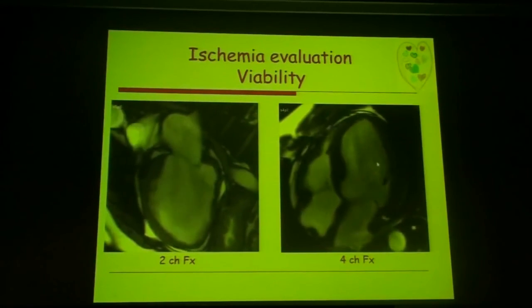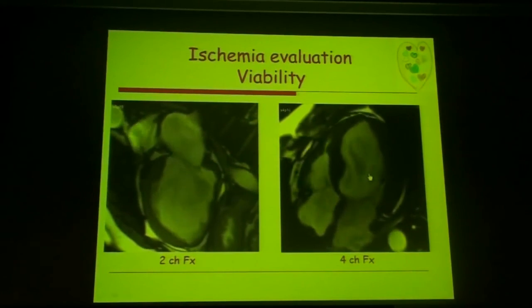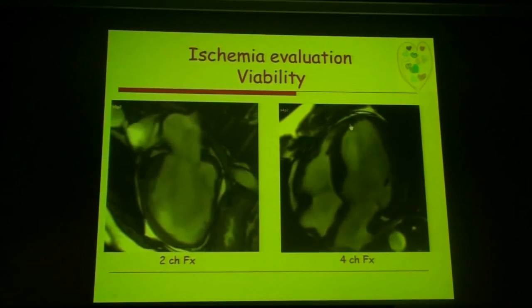When we're looking at the blood here, note how the blood swirls within the ventricle. The ventricle does not contract as seen previously, very nicely. The blood just stands there. By the way, these patients are prone to have LV thrombi, and we are looking for LV thrombi as well, even though it does not have an LV thrombi.